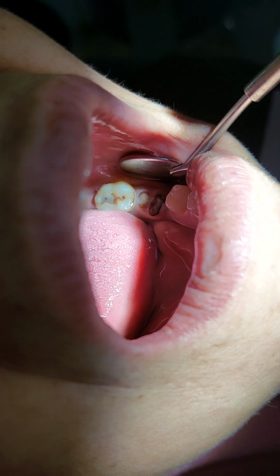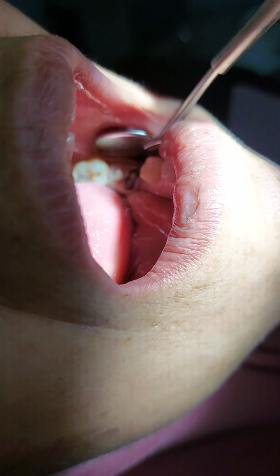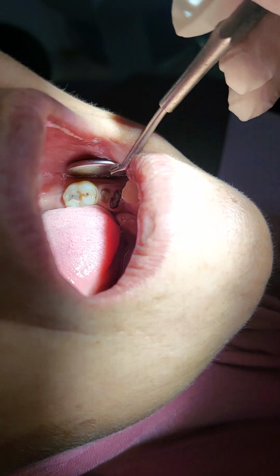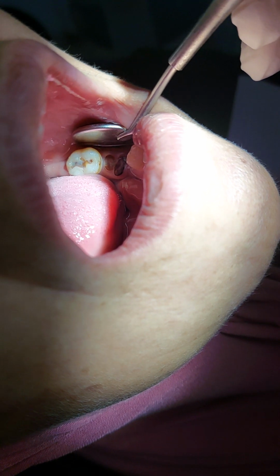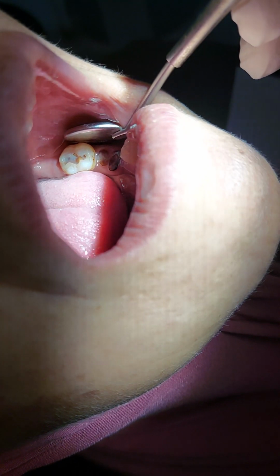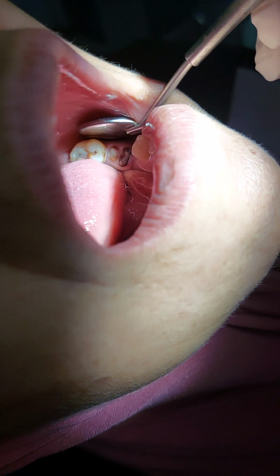But looking at the mesial drift of the roots with the distal drift of the 5, that means there was a molar there, and this is now the 7 shifted mesially, and the wisdom tooth now is what we have. Okay, can you prepare this as a bridge? You can. What are the precautions? This is a mesially tilted tooth. What are the precautions? Yes, pulpal damage. Might be. Okay, I'll explain that in a video in a moment.